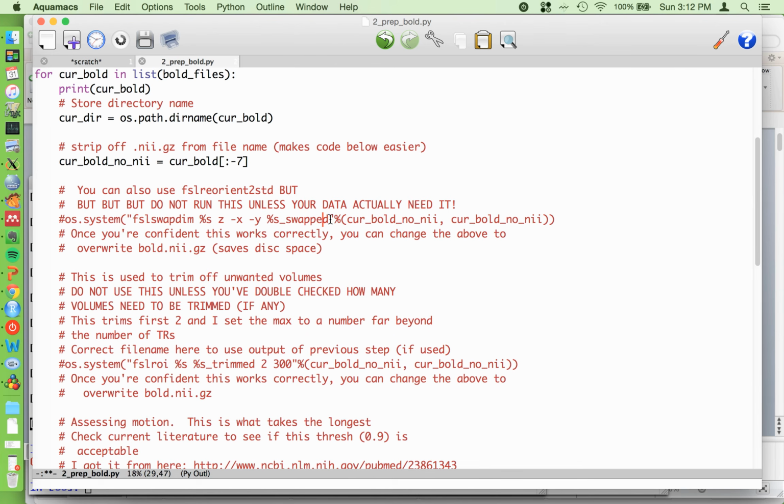So anyway, once you're confident, delete this part. If you're not, keep it in there. But I would be pretty upset if I was the person paying for your disk space and I found out you're creating 4 copies of a single file.